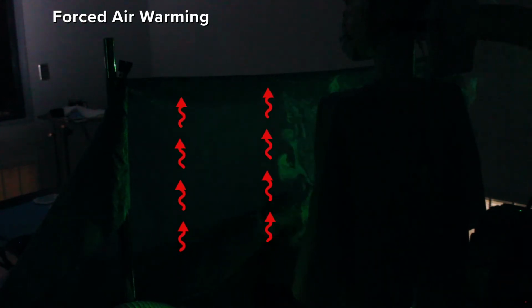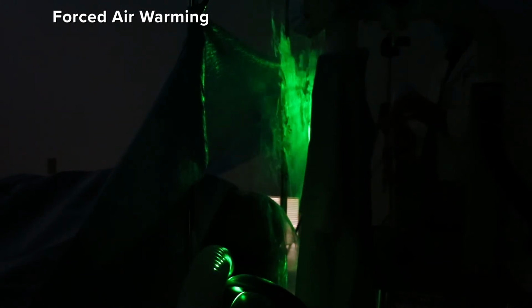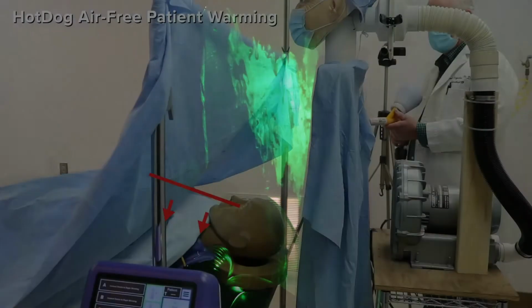A dozen studies have shown that forced air warming systems contaminate the sterile field, which can lead to increased infection rates in certain procedures. But this is the first time that it's been shown how forced air systems can transmit airborne particles to the breathing zone of the operating room staff.